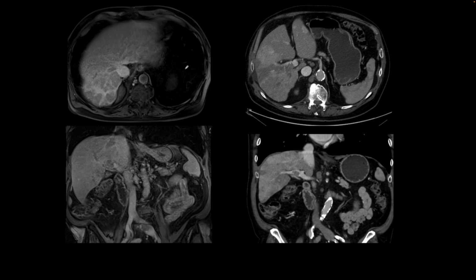Here is our next patient, and there are two sets of images. The images on the left are T1 weighted post-contrast axial and coronal images showing a filling defect in a hepatic vein draining into the IVC right there. And the coronal image shows the finding in another view where a tumor has grown into the hepatic vein and is going towards the IVC. And one tumor that has the propensity for doing that is hepatocellular carcinoma.